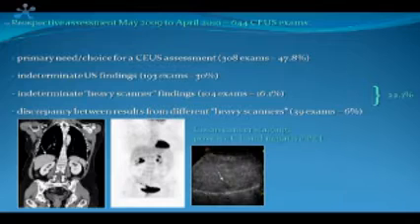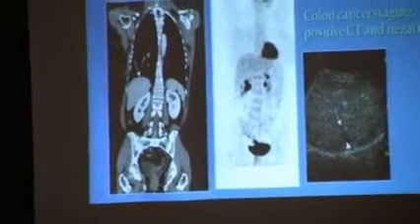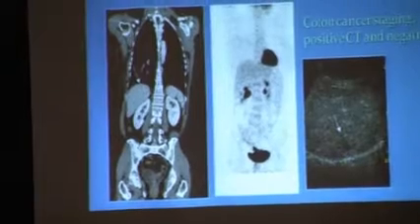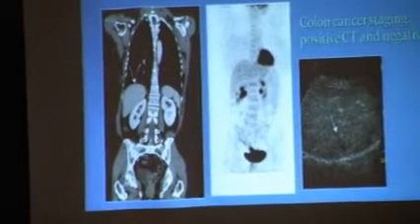This is just a case: positive CT, negative PET, CEUS shows small metastasis. This is not because CEUS is better than the other imaging modalities, of course, but just because it's a very simple technique which can be performed immediately.